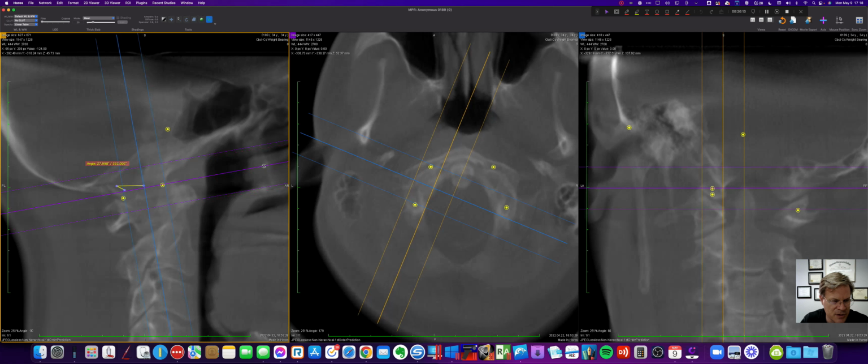And he would look at these x-rays through the sinus straight down there, and because of the curve here, this middle purple line would be basically touching that curve, and so you get a little bit better view right in there. But I can't really see very clearly what's going on there. So let's get rid of that.